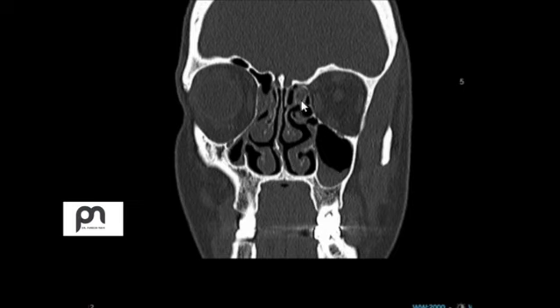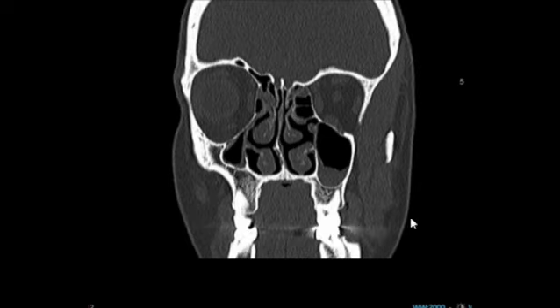Compare the scans with the other scans, and compare with the other normal findings. Almost always you will at least be able to identify that there is something abnormal. So if your senior surgeon asks, you can at least say, okay, I find this is abnormal. The right sinus looks smaller than the left side. That's it. So this is the classical case of maxillary sinus hypoplasia. This part as compared to this is smaller.